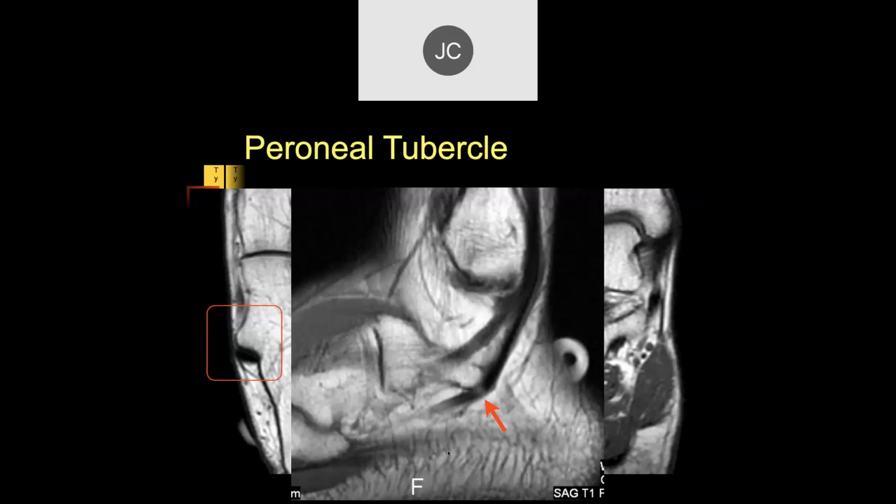And the things you look for in symptoms are edema within the longus tendon in this location, which we don't really have here, and more importantly, edema within the peroneal tubercle. And I think bone edema within the peroneal tubercle is pretty highly associated with symptoms. Not 100%, but that's kind of what you look for to try to determine whether it's really a clinically significant finding, that and a marker right next to it showing where the pain is.